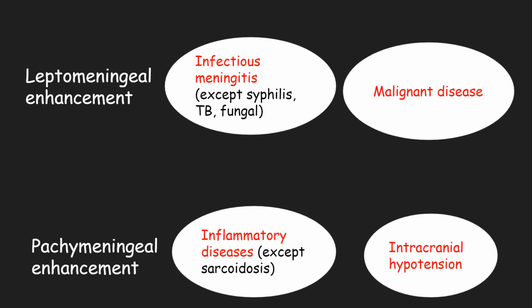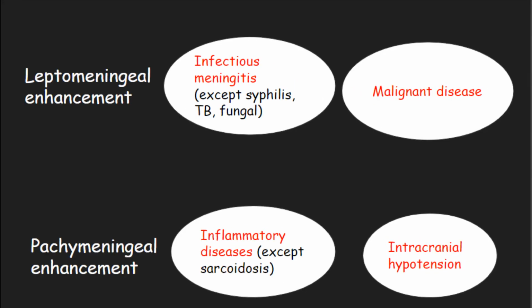Leptomeningeal enhancements are present in infectious meningitis and malignant disease, and pachymeningeal in case of inflammatory conditions and intracranial hypotension. These are some examples of such enhancements.